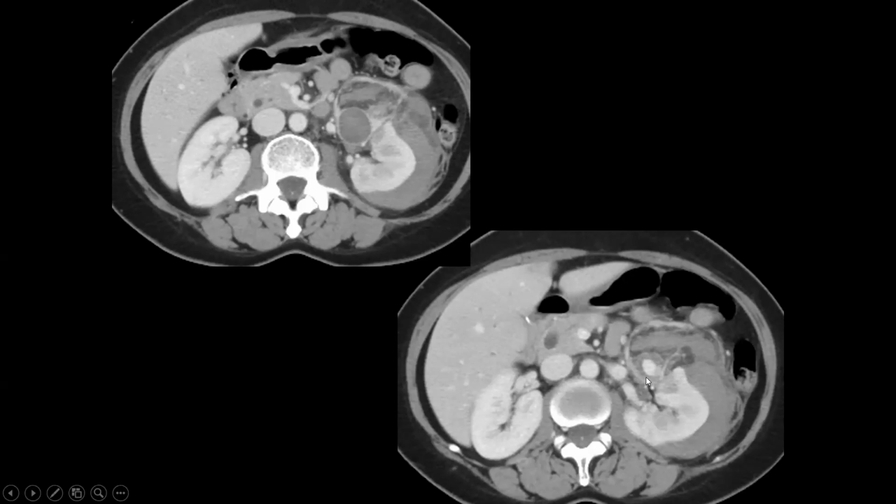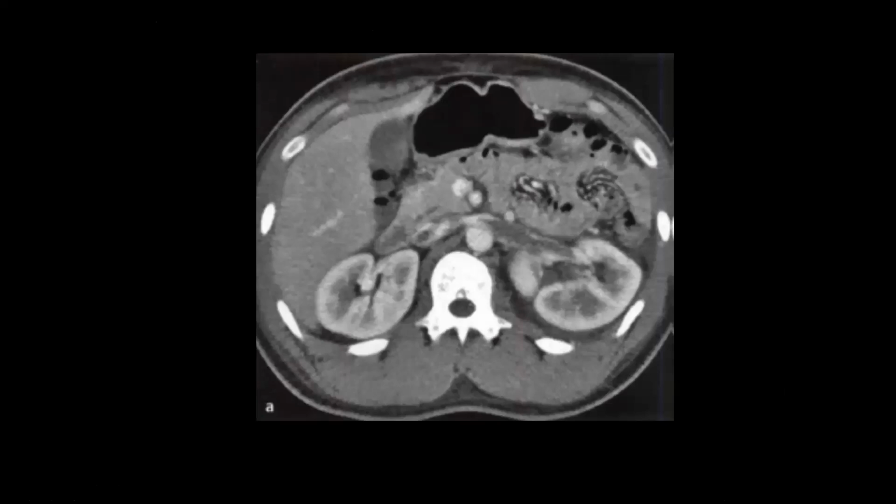The vessels in angiomyolipomas are abnormal, and they are prone to develop aneurysms, and these aneurysms can bleed. So this fat density lesion, if you see a lesion in the kidney with fat density, this is diagnostic of an angiomyolipoma. In addition to that, we found this aneurysm and perinephric bleeding. The next step is to call the interventional radiologist or surgeon to help manage this patient. They can be embolized, or otherwise nephrectomy needs to be considered if the bleeding cannot be controlled.